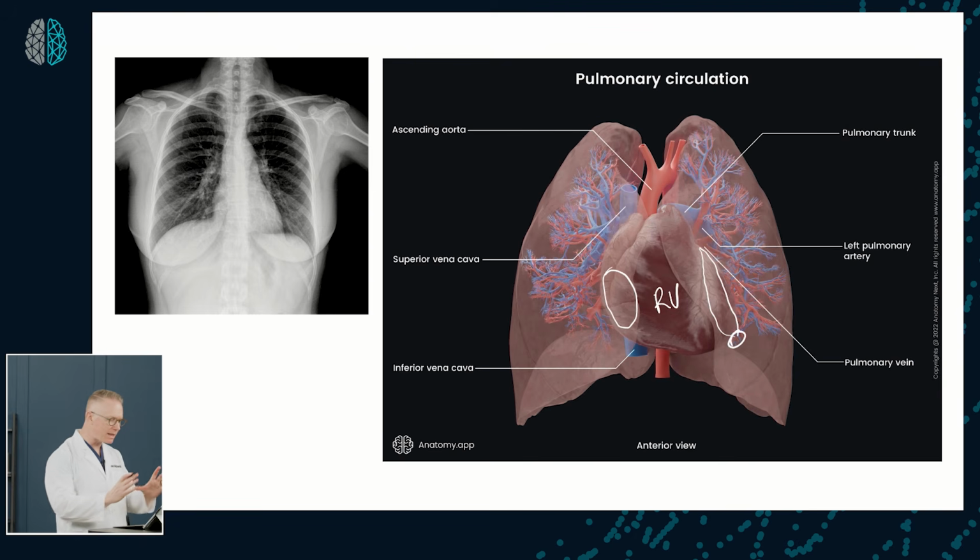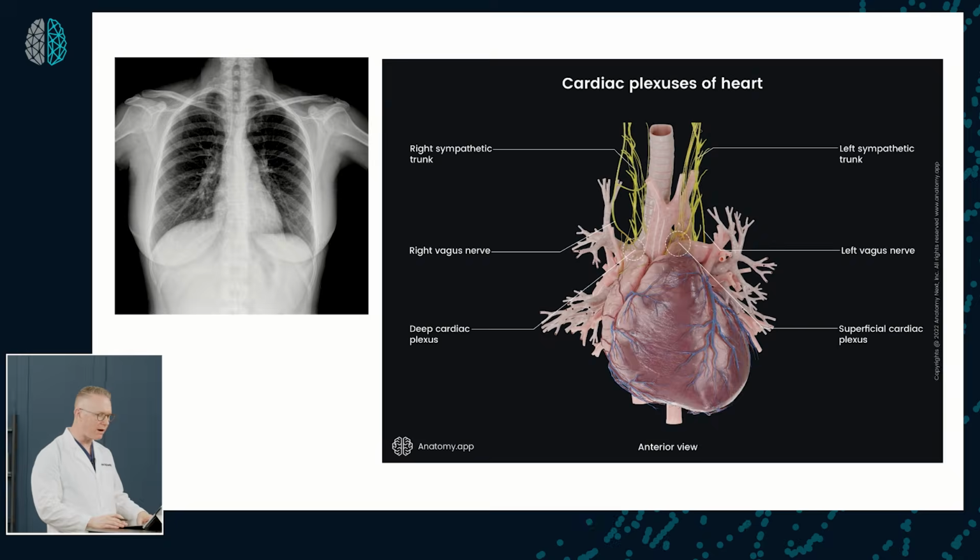But if you were to take that and now put that over into that chest X-ray, those are some of the things that you're seeing, even including some of the vascular markings that are there.